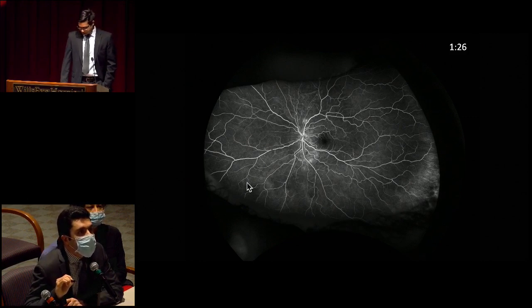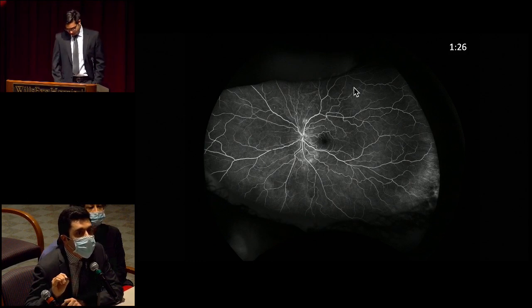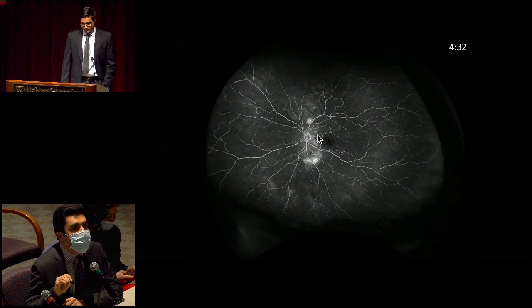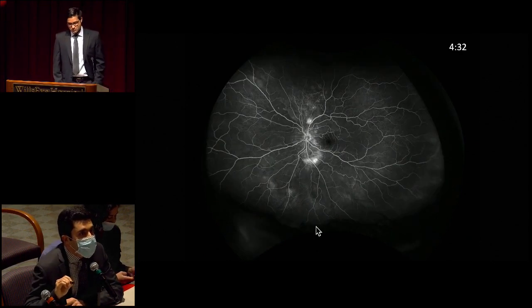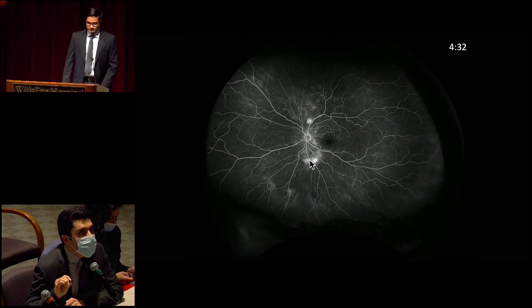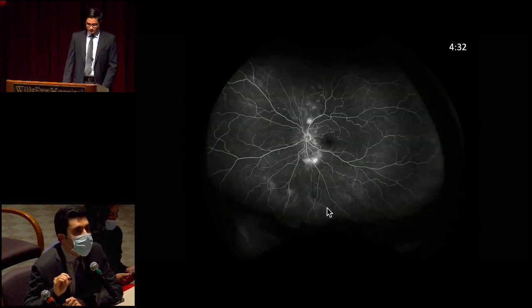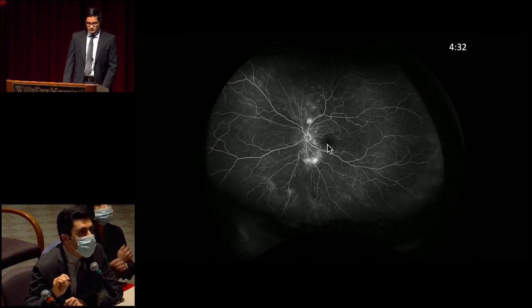Again, retinal vascular perfusion itself seems to look good, and our attention is drawn to similar areas, albeit less extensive, localized to the posterior pole mostly, and deep foci of hyperfluorescence, again probably localizing to the choroid at this point. And then a late frame. Again, similar appearance, expansion of these areas suggesting some leakage. The disc itself looks okay. No macular edema.